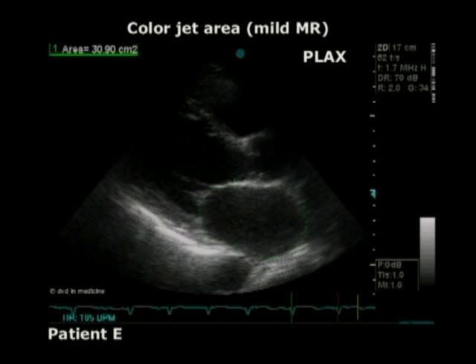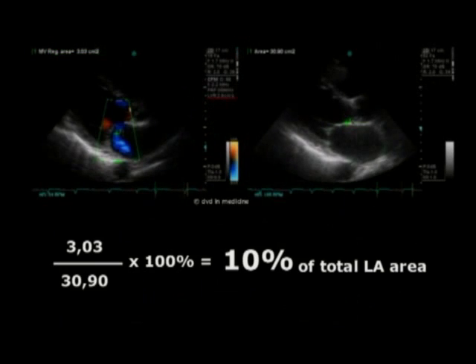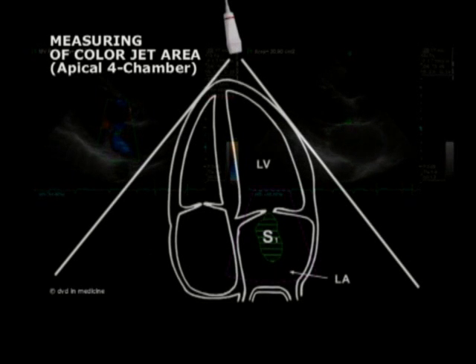The LA area is around 30 centimeters squared. The jet area is 10% of total LA area.